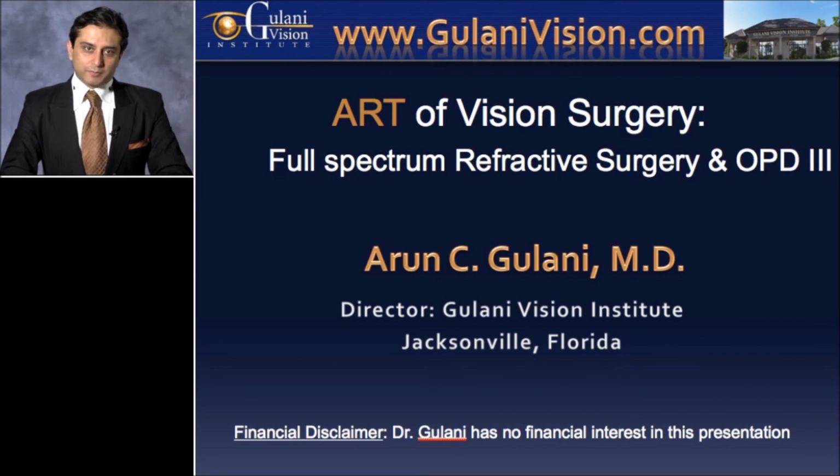Today I'm going to talk to you about how I use the OPD-3 in my practice, what I call and teach all the time the art of vision surgery, which basically means how you apply all the aspects of refractive surgical techniques in our armamentarium, including technologies, to design a surgery for each patient to the best vision potential they can achieve.